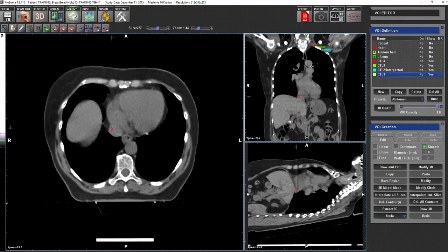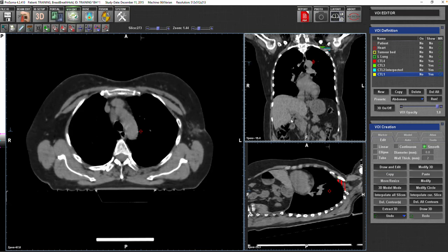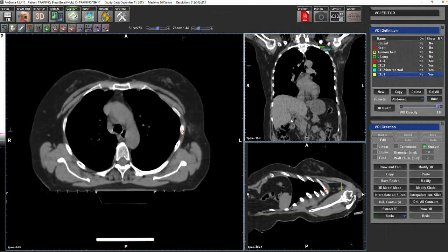I said that you can easily count it in the coronal view, 1, 2, 3, 4, and then you put a mark at level 4. So rib number 4 is not only for the internal mammary vessels at the sternum, it's also the caudal border of the axillary lymph node, CTL1.